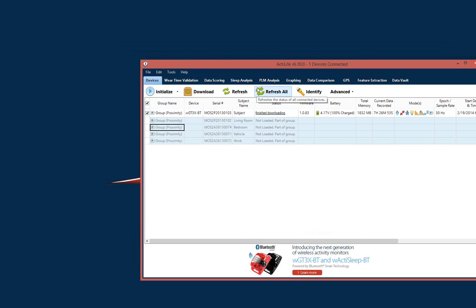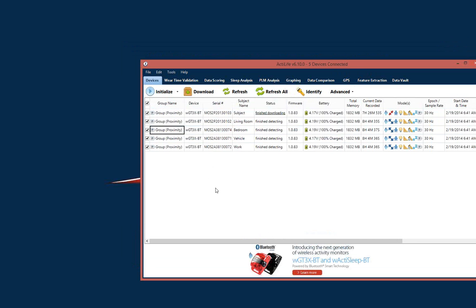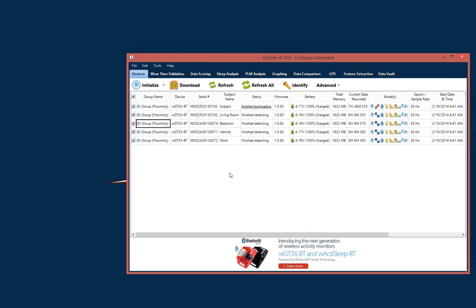Okay, I'll plug them back in. Let's assume that we've now done this deployment and now we're ready to collect the data.